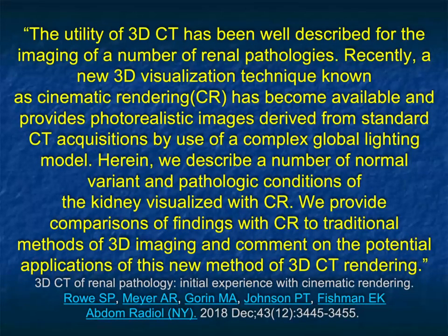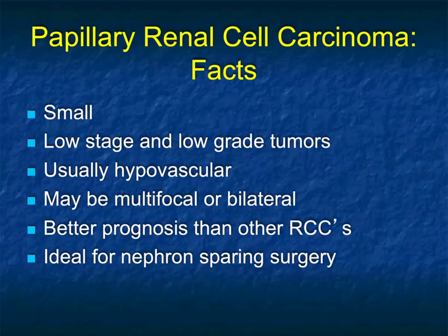Now, on the cinematics, I showed you the 3D imaging. A good article by Rowe talks about how 3D is very valuable, not only in staging patients, but preoperative planning. Cinematic rendering becomes very important in determining what patients can or cannot get partial nephrectomies, also potentially for looking at tumor necrosis. And we think there are other bits of information we can get because, remember, as opposed to looking at routine axial coronal images, cinematic rendering tells you a lot about texture, and texture tells us a lot about patients' tumors. So that's clear cell.